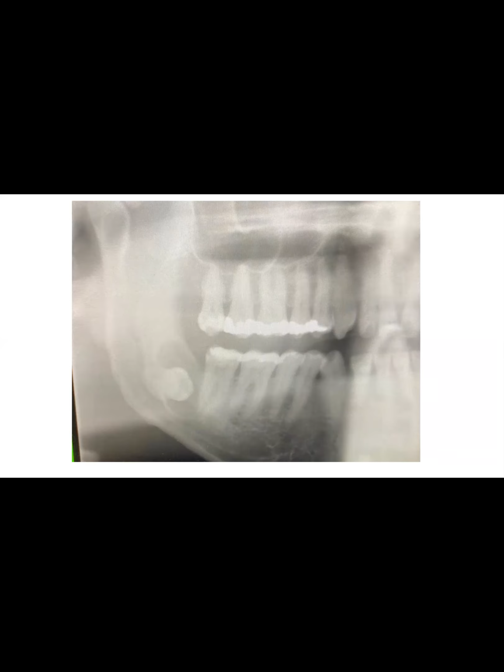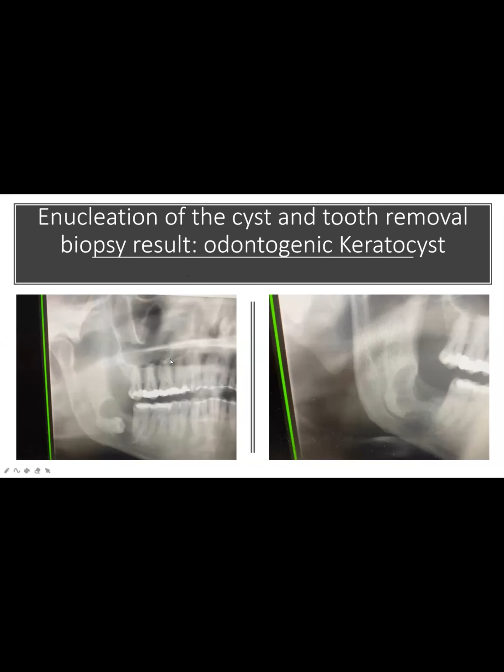No clue. Would you see the patient? What does keratocyst tend to be? Do you want to see recurrence? Yeah. Maybe? Right. So this is what we actually did, right? We see the patients, and we take a pan every year and we observe the area, right? So maybe Dr. Sally can show us the final radiograph. Right? Not bad, eh?